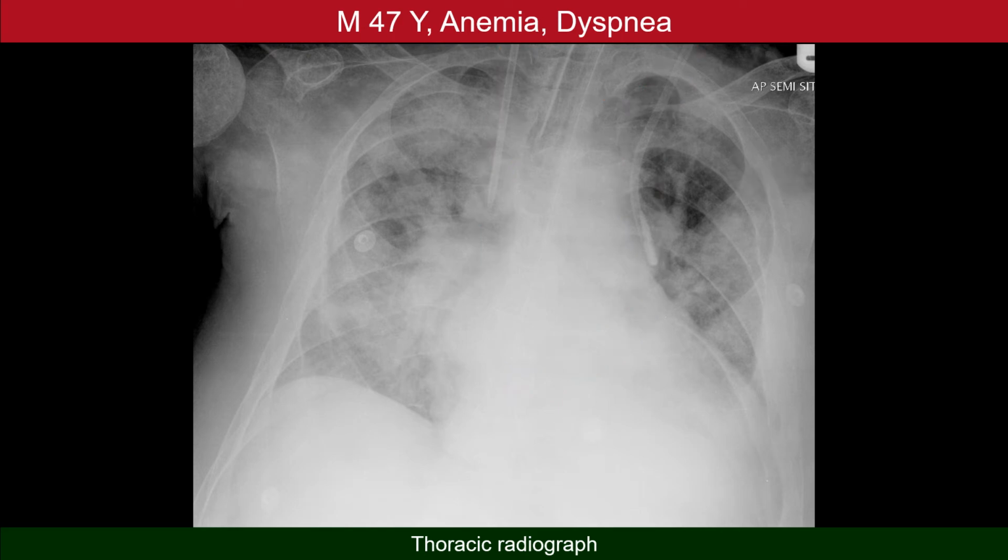The second scenario is completely different. It is an anomalous pulmonary vein, the left pulmonary vein, which drains here into the left innominate vein. The direction of blood, of course, is from down up in the second scenario and from up down in the first scenario.